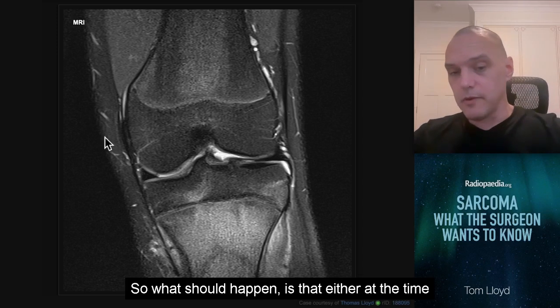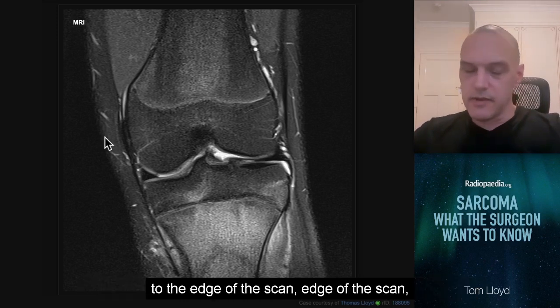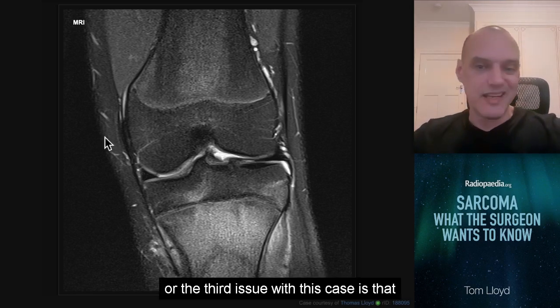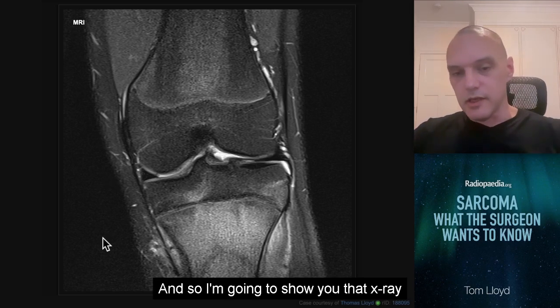So what should happen is that either at the time or when you recall the patient, you scan back down to normal bone, because there's something going on that goes to the edge of the scan, and we don't know how far it goes. And the third mistake, or the third issue with this case, is that there was no X-ray performed. The X-ray is absolutely fundamental, and so I'm going to show you that X-ray now.